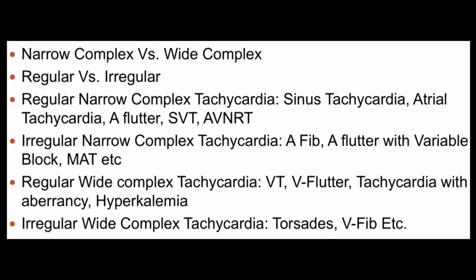So next, let's talk about tachycardia. In order to evaluate tachycardia, we need to quickly determine, is this a narrow QRS complex or is this a wide QRS complex? So is this a narrow complex or wide complex tachycardia? Is it regular or irregular? Now, a regular narrow complex tachycardia could potentially be sinus tachycardia, atrial tachycardia, atrial flutter, SVT, or AVNRT.